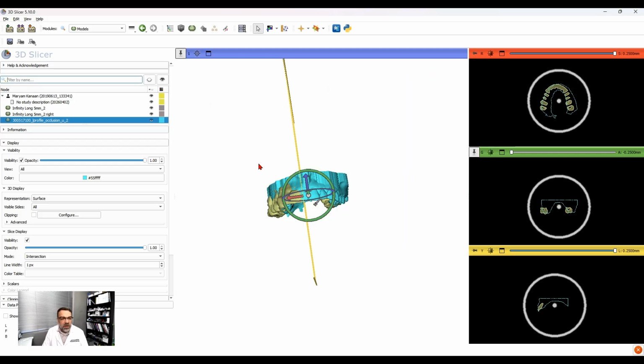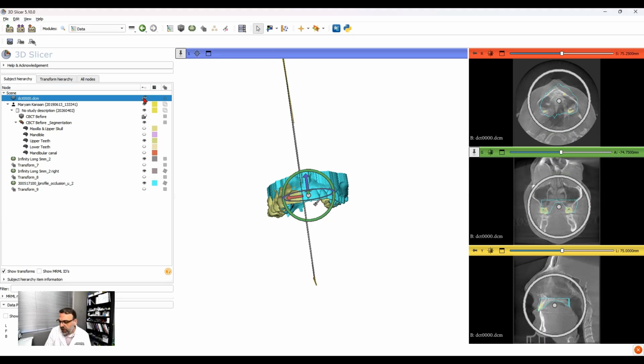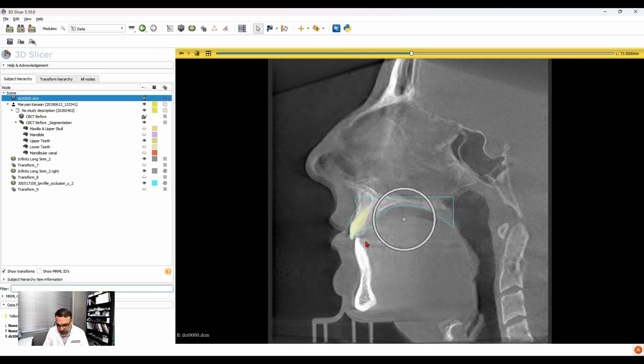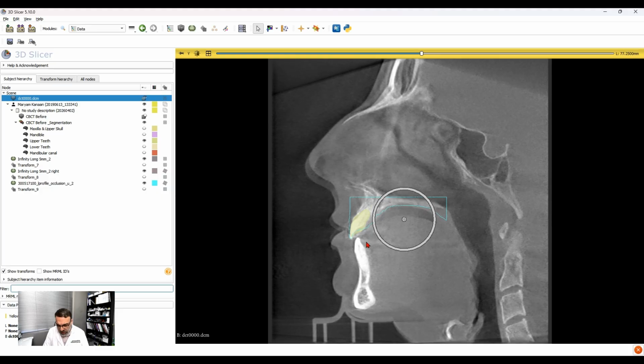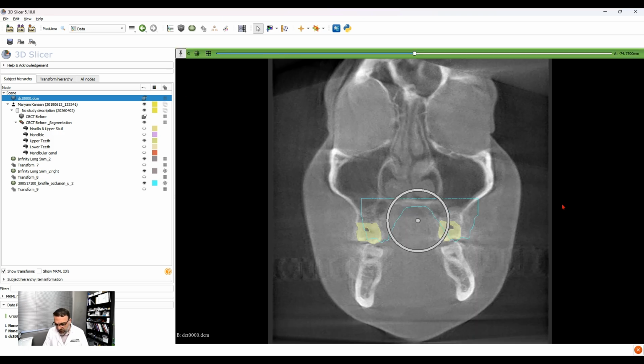I think I cannot see these X-rays because they are turned off from here. Let's see. Yep. Okay, now we have this X-ray. See, I have clicked the hide button on the main one, so now we can see it here. And let's see, it looks okay. Maybe I will go a little bit lower. Okay. And you see I am off to the right side.